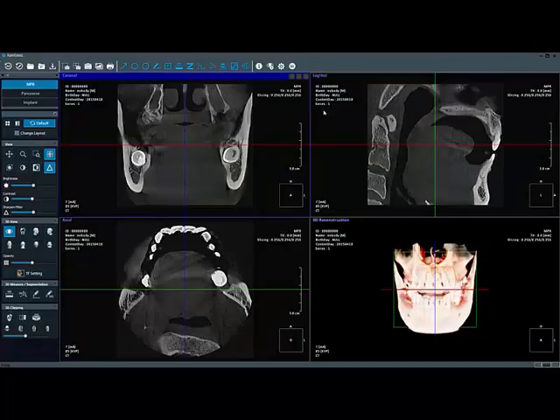This region will be the rendering window, where your patient's images are displayed. The rendering window breaks into 4 windows: coronal on the top left, sagittal on the top right, axial on the bottom left, and 3D image on the bottom right. Each image contains the patient's information, information of rendering mode, information of length, and scanning information.